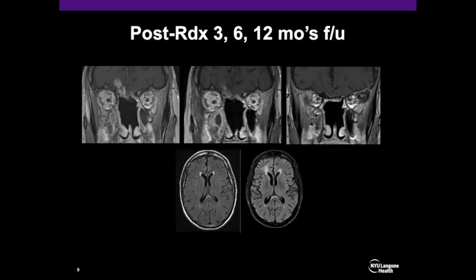So in that case, we had to give a differential diagnosis, post-treatment change versus local recurrence. Please do short-term follow-up. Lucky enough in that case, the 6-month follow-up showed partial resolution and the 12-month follow-up showed total resolution of the enhancing nodule.